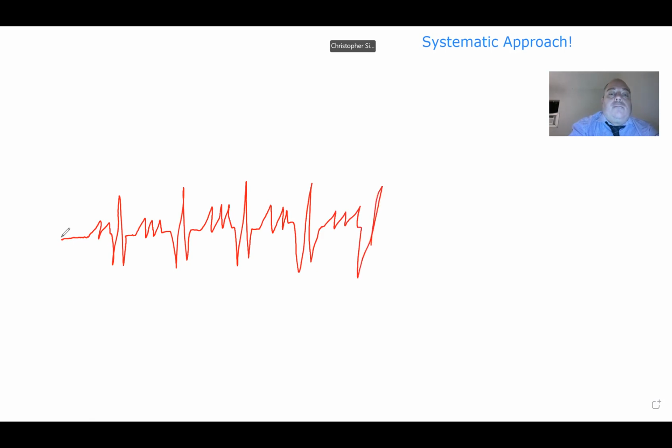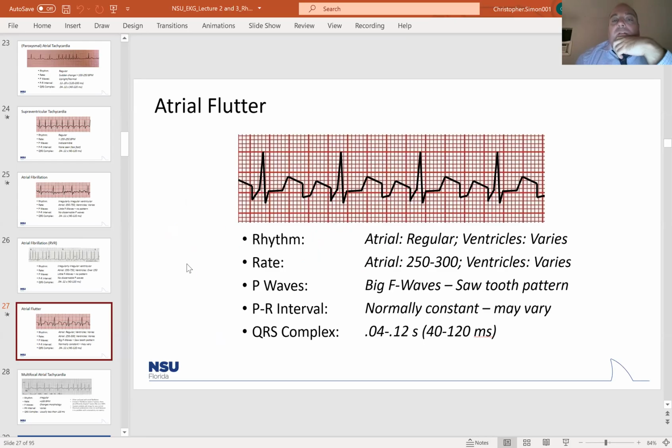What's going to happen a lot of times, guys, is your T wave is going to get overcome by your flutter wave, okay? So let me go back and see if it was on the strip we were just looking at. Yeah, so let me show you something here. This was a strip of a flutter. And let's just label some things. So these are your QRSs.